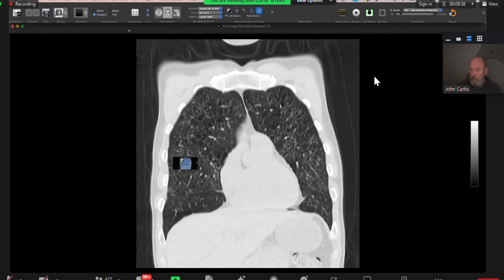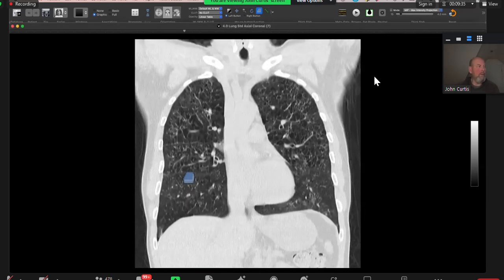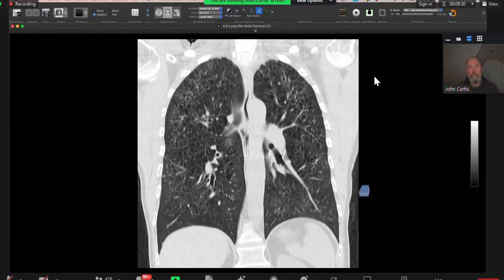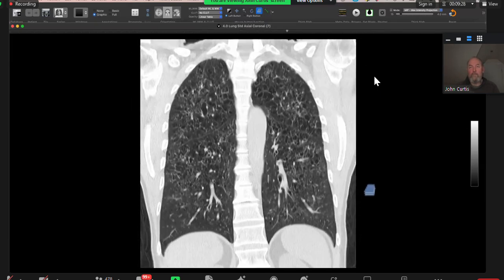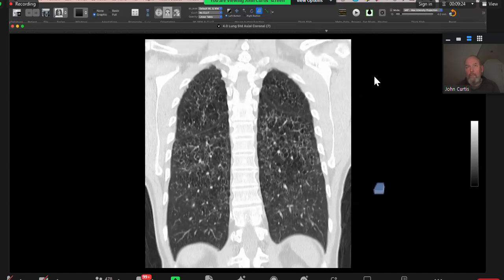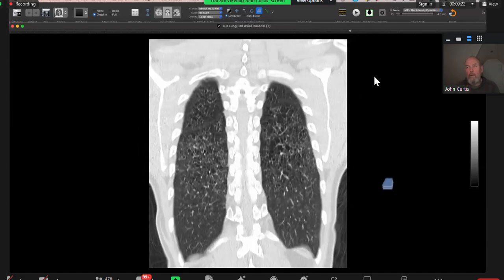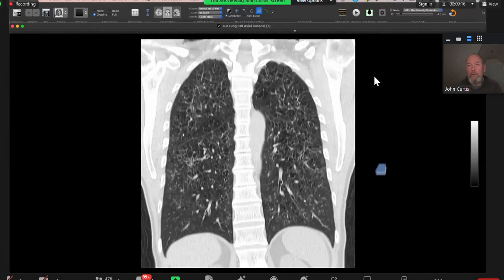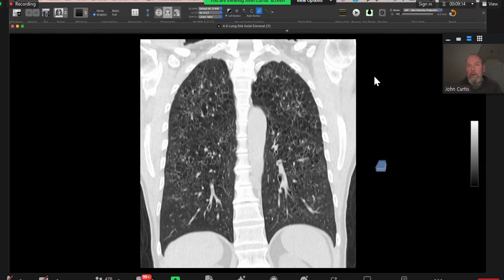Okay. So I'm provided with the coronal sections of HRCT of a skeletally mature patient, in which I can appreciate that there are multiple centrilobular emphysematous cysts noted in bilateral lung fields, predominantly in the apical and the mid lung segments. Did you say centrilobular? Are they a bit random?